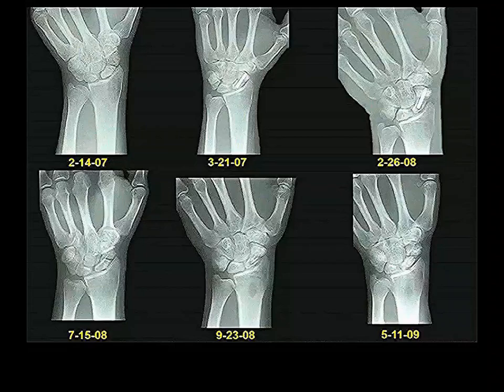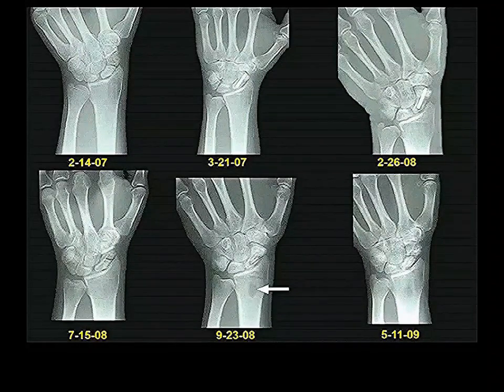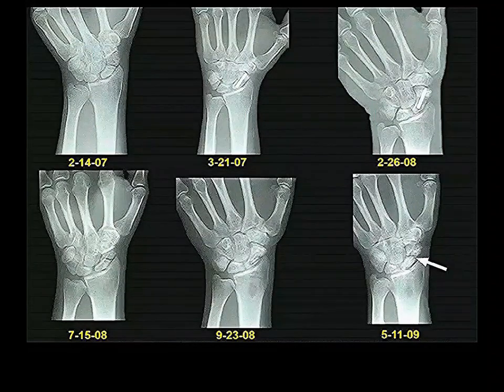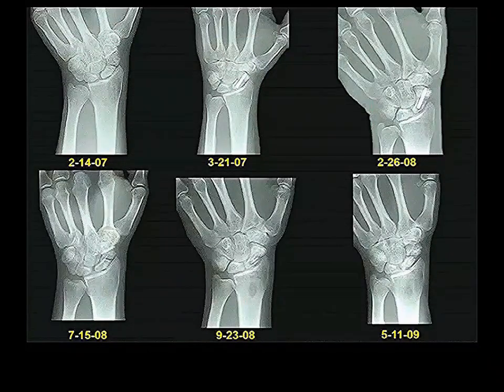So let's take a little bit of bone from our radius. That's why it looks a little bit more radiolucent here. They chipped off some of the cortical bone of the radius, and they jammed it in between these things as a bone graft, hoping that that would promote cure. And here it is, no healing whatsoever. So this has been a failure to treat this.